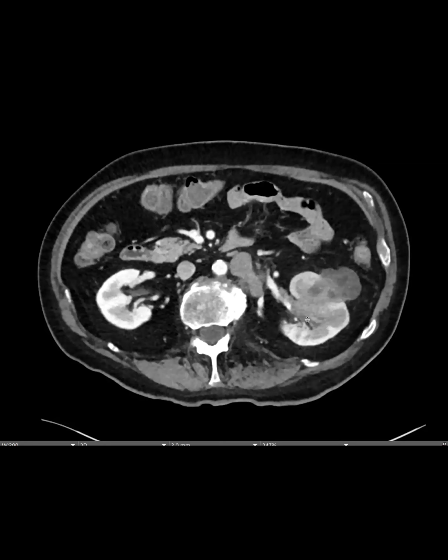So there are several points that I took away from this. Number one, my position right now on Bosniak 2F is that we follow them too much and too aggressively. And that's for 2F, not 3s. This was a Bosniak 3 and 4. But even then, you have these kinds of cases where you just reconsider your thought. I'll share that we don't really have any long-term outcomes data on the effectiveness of these surveillance protocols and recommendations that are endorsed by various guidelines. But this is one of those cases that kind of forces you to think again.